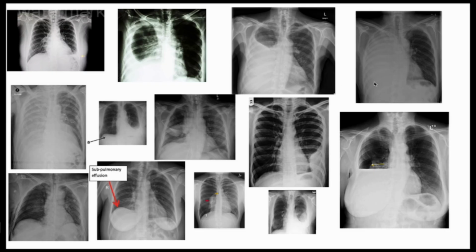A complete pleural effusion may appear like that, with complete homogeneous opacification of the hemithorax, with minimal displacement of the trachea, can be seen as a complete pleural effusion. The hydropneumothorax, on the other hand, may be seen by a transverse line, a linear line like that, which is an air-fluid level. With an air-fluid level, then we say there is both air and fluid, which is hydropneumothorax.